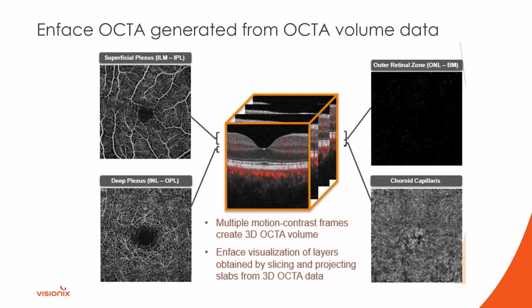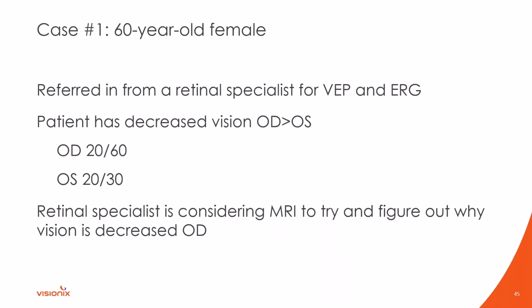Let me show you a case that utilizes en-face imaging from OCT, not OCTA, but OCT. This is a 60-year-old female, referred in from a retina specialist for electrophysiology testing, actually. The retina specialist sent this patient in and said, I can't figure out why this patient is 20/60 in this right eye. I'm evaluating the retina.